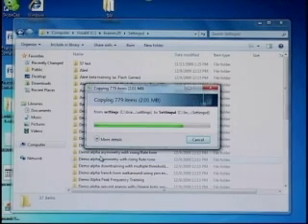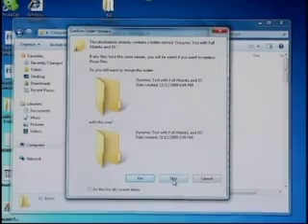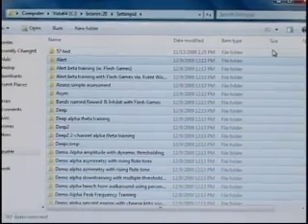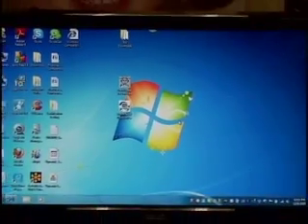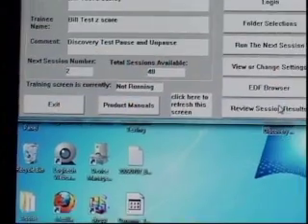So we're actually filling the library in the Discovery software with all of the settings files that we've used in BrainMaster before. Any of the ones that are duplicated, simply skip. Now let's close this and look at it from the BrainMaster Discovery software to see if it was complete. We'll go to the BrainMaster Discovery.